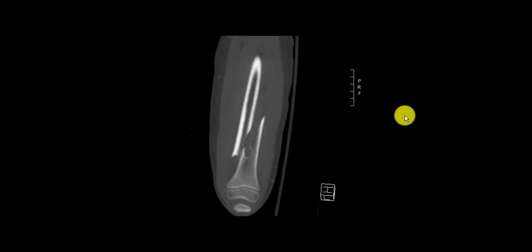All right, so as you can see, this is a young kid, skeletally immature, with a fracture through the femur. Now that's the most obvious finding, but there is something else going on here, and that is this. Notice this lytic lesion. It's got a sclerotic border. It's somewhere between the metaphysis and diaphysis. And I can tell you, any radiologist will tell you that this is a benign lesion.